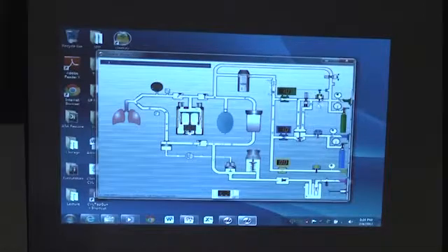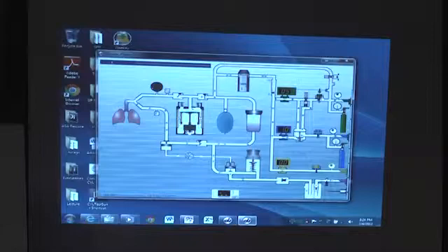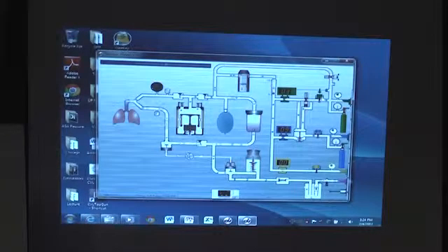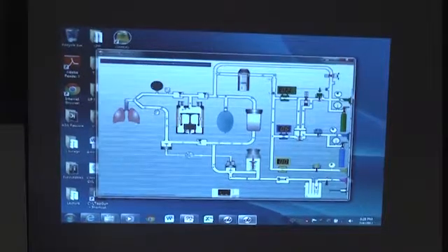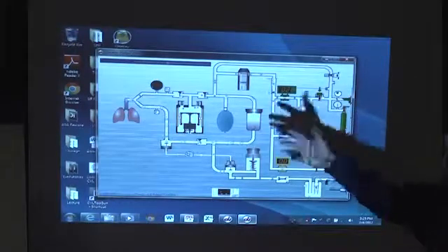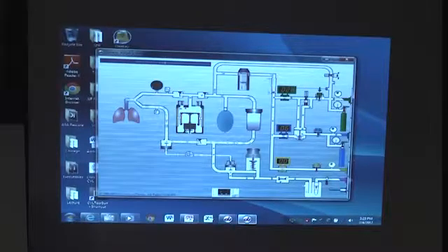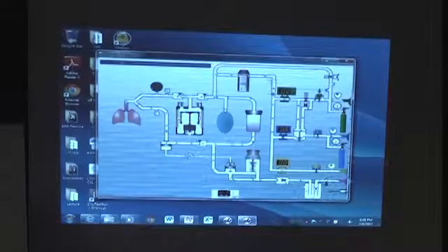So if I were to decrease my oxygen flow and not even touch my nitrous knob, at some point, because the flow is less, there's less pressure hitting the top of the diaphragm, then the spring will start, you see now it went from 1.0 to 0.9, and now went to 0.6. So that's how the proportioning valve works. But do you also see from this, that if this was really nitrous, the hypoxic guard doesn't do anything, it would still work, because it's based on the assumption that what is in the pipeline is always oxygen.